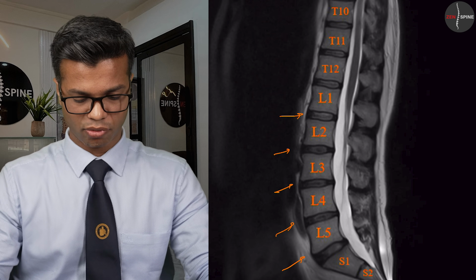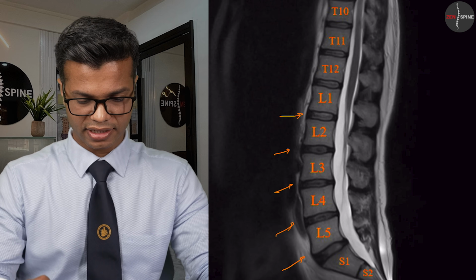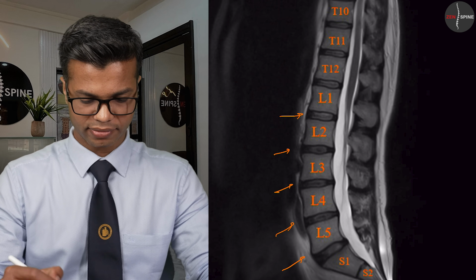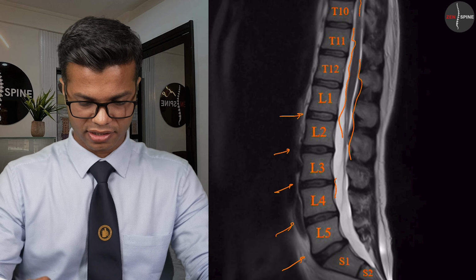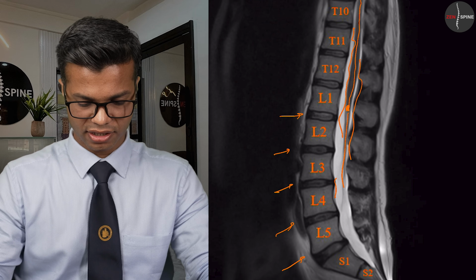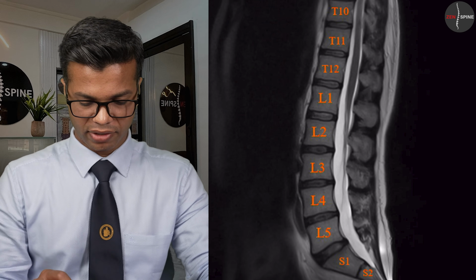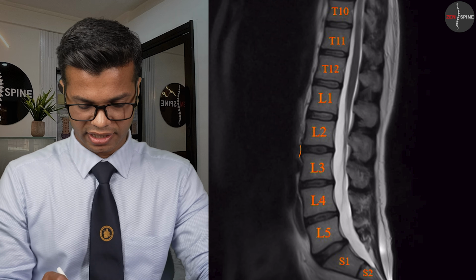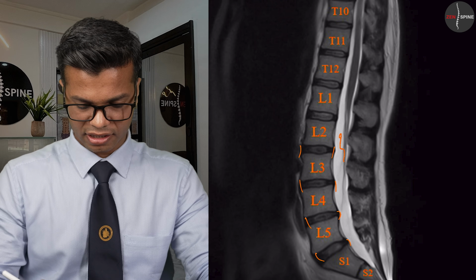Now, behind these vertebral bodies and the intervertebral discs is the spinal canal, in which you can see this white fluid. Inside the white fluid is floating the spinal cord, which is this black structure which finishes at the level of L1, and then these are just the nerve roots floating in the spinal canal. Now, a normal lumbar MRI scan will have this intervertebral disc contained in their margin in the front and the back, and the nerves are floating freely in the spinal canal.